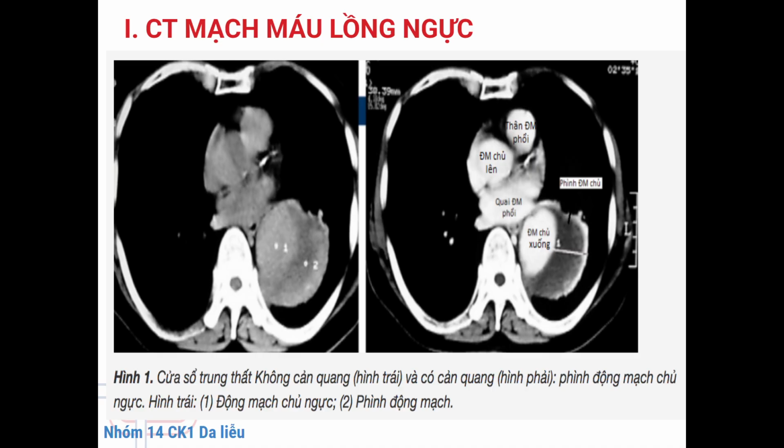Computed tomography angiography (CTA) of the chest provides essential diagnostic criteria for a wide range of aortic and pulmonary arterial diseases. For aortic aneurysm, CTA demonstrates a permanent dilation of the aortic diameter, measuring at least 1.5 times the expected normal size for the specific anatomical segment. The contour is usually smooth and mural thrombus may be present in chronic lesions.